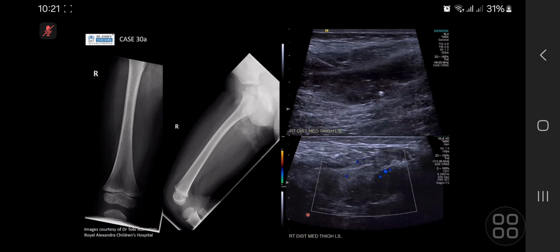Okay, so I'll give you more history. There is not much of soft tissue changes, but mom says when the patient is particularly active, you look a bit closer, you wonder if there's some calcification within the soft tissues here. And then perhaps this could relate to this.